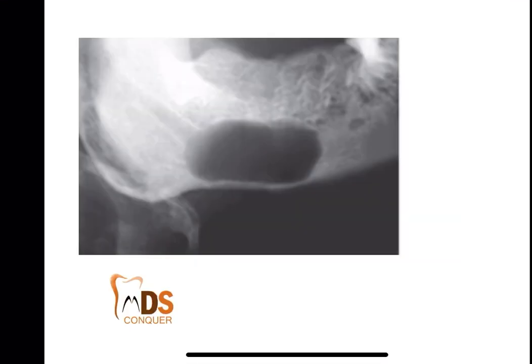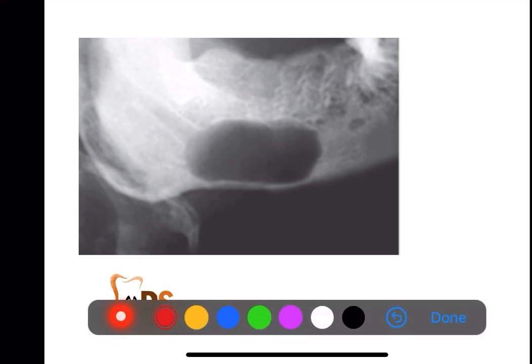Next, coming to one more finding. Now this radiograph is given. First step, localize. So where is it?